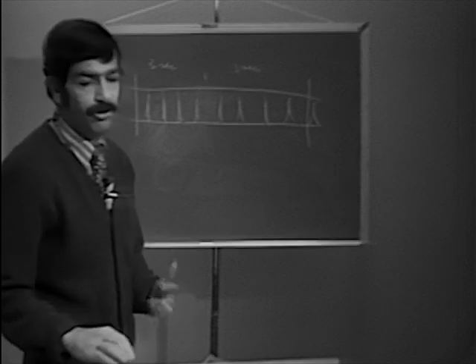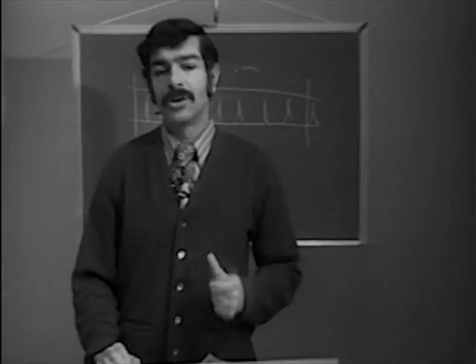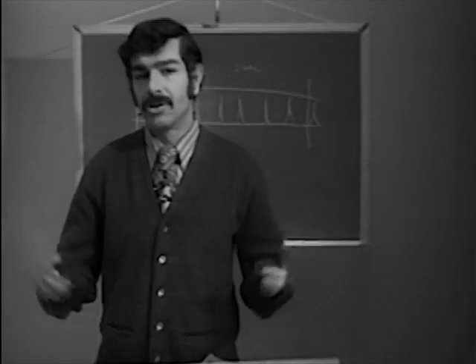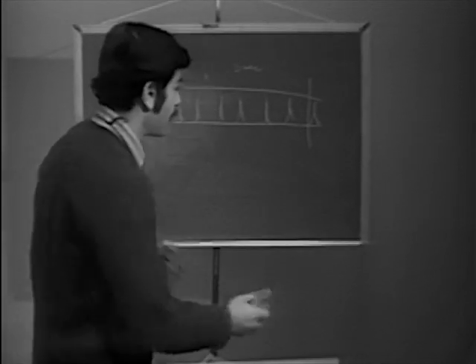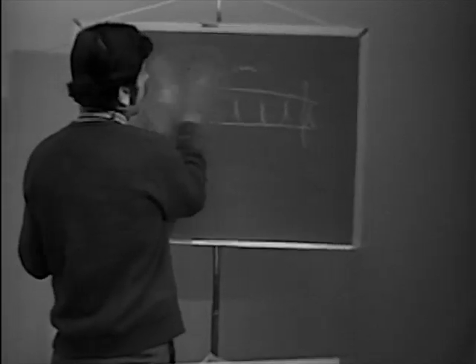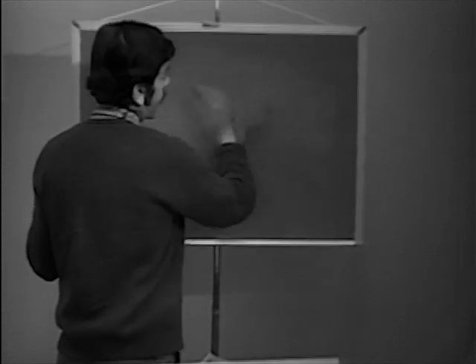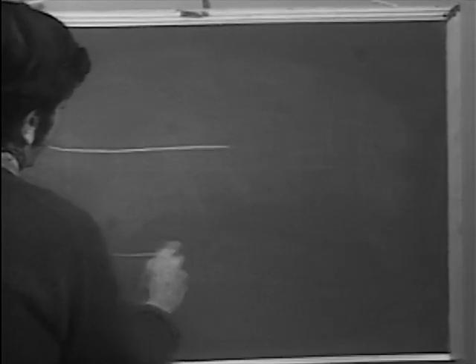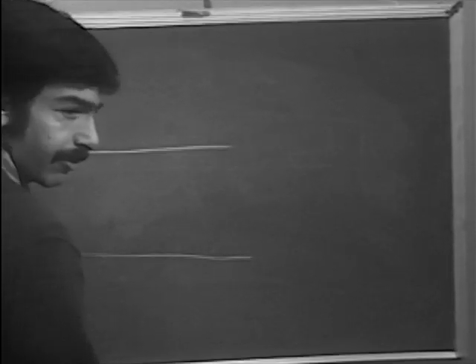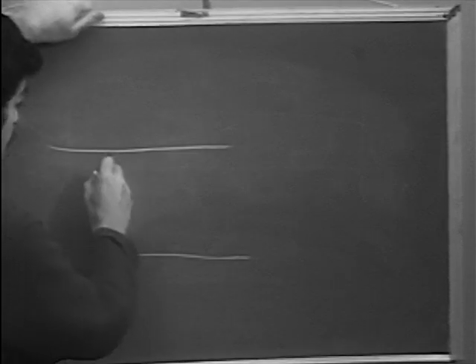Okay, now, usually when we look at an electrocardiogram, we don't see a long 6-second strip. We just see very short strips after they're mounted. And if the rate is regular, it's helpful to remember this little guide. Here's our strip of electrocardiogram that I drew before. This is a little bit larger now.